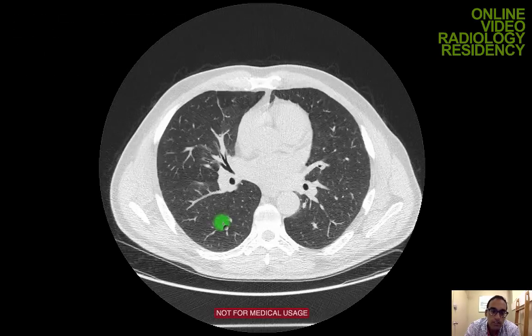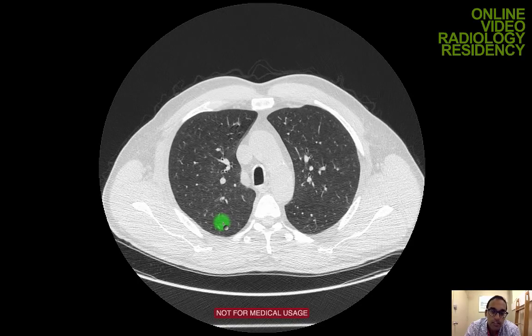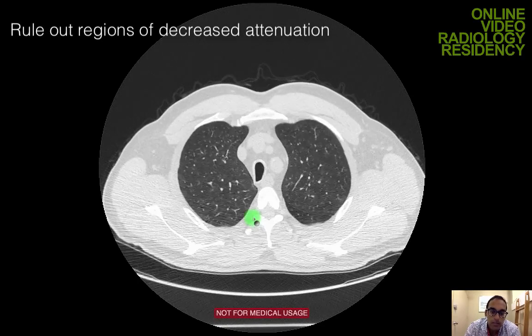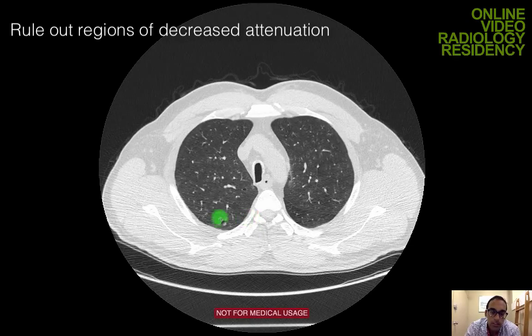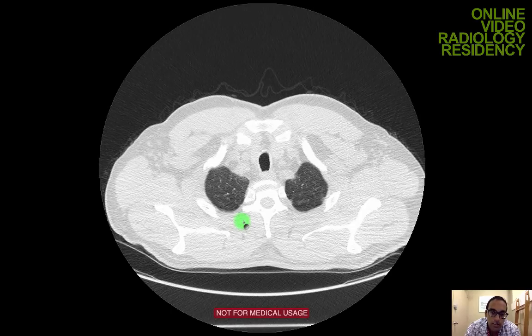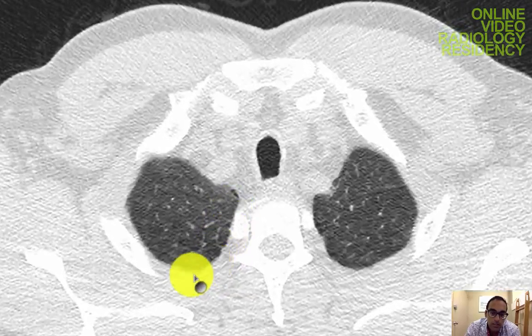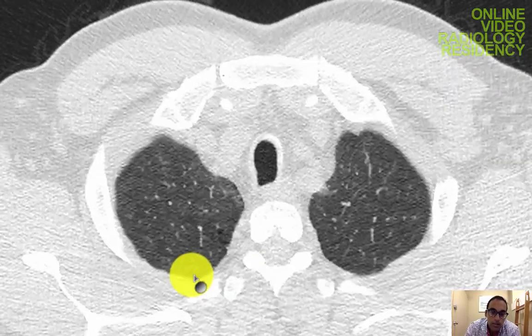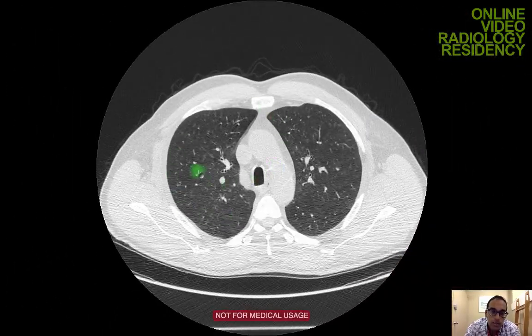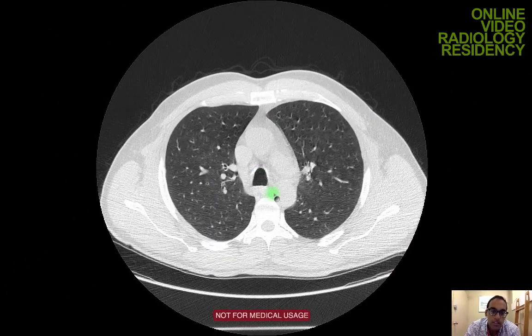And there's another category of lung disease where you can have cystic changes or increased lucency of the lung parenchyma. And this patient actually has a very mild form of that. You can see these small cystic changes here in the lung periphery, especially here at the lung apices, subpleural lung, and that's just mild emphysema.